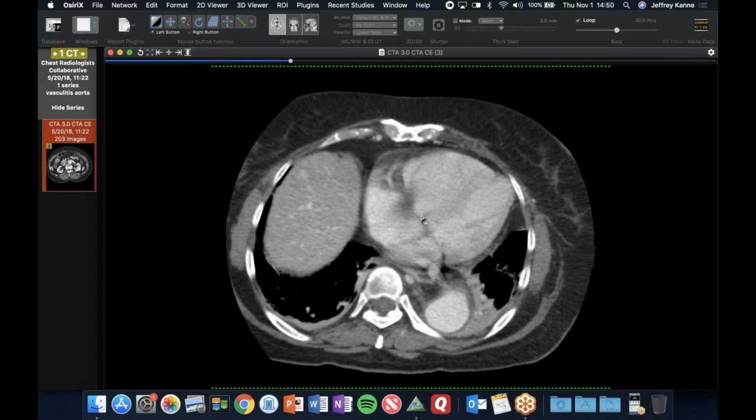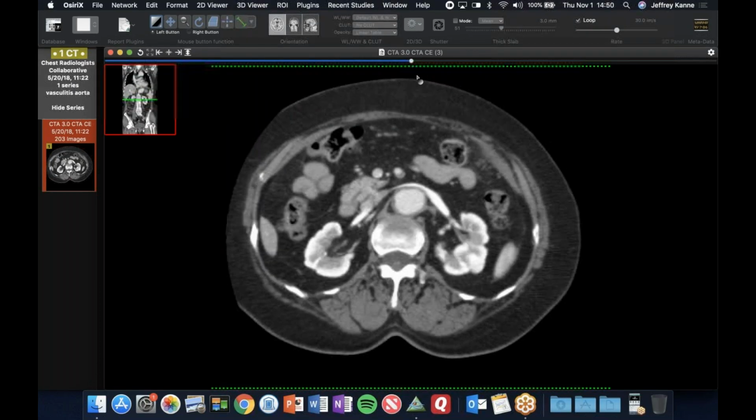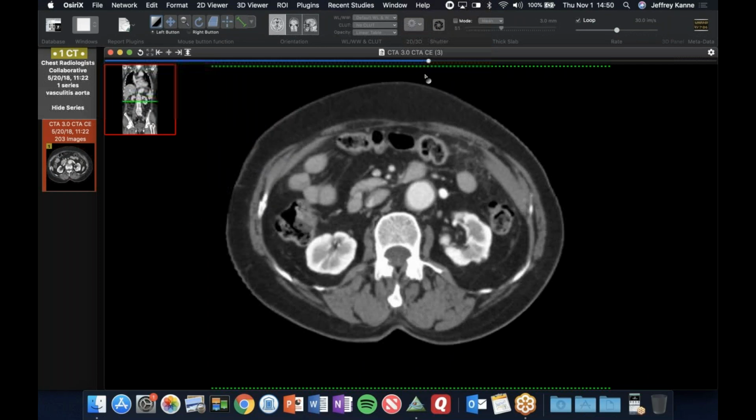With this much disease in the aorta, I've seen it with the neck vessels and leg vessels, and not just the aorta. So yeah, I don't know. I found some papers on it, and they just referred to it as an isolated aortitis. So, it probably is. Maybe it just hasn't declared itself systemically. Who knows? Jeff, there wasn't anything around the kidneys, a la Erdheim-Chester again? No, and this is not soft tissue around the aorta.